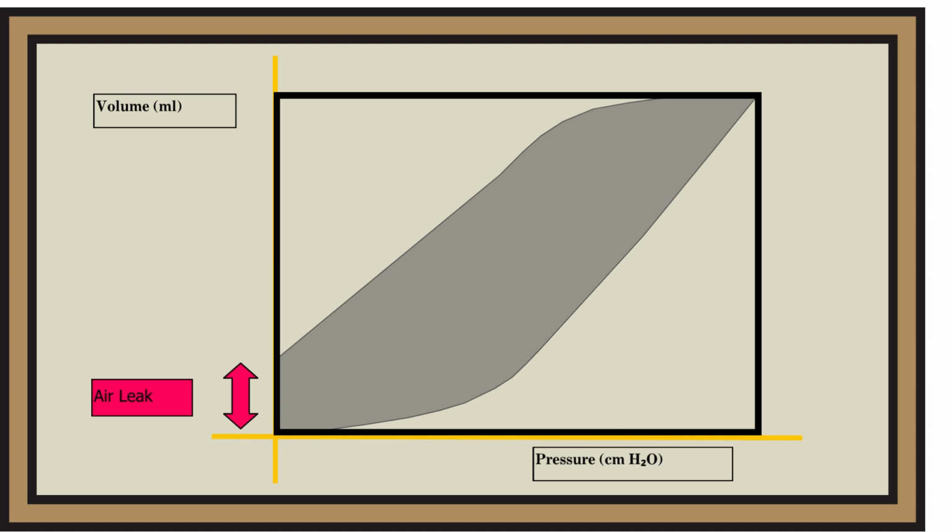When the expiratory curve does not return to zero volume, an air leak is present. This is where we have, as you see, air leak.